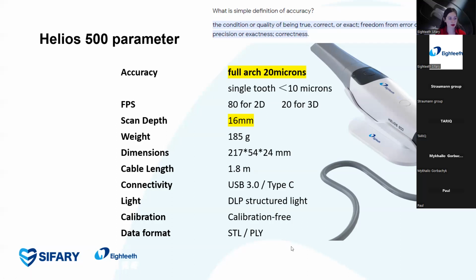The data format is STL, PLY, you can take it down. I'm going to explain what they are, but basically after you scan, in order to send to the laboratory, you need to export. The data format needs to be STL. Okay?